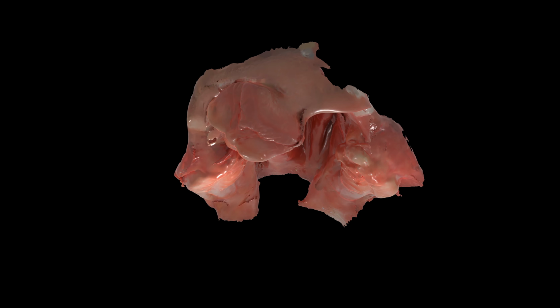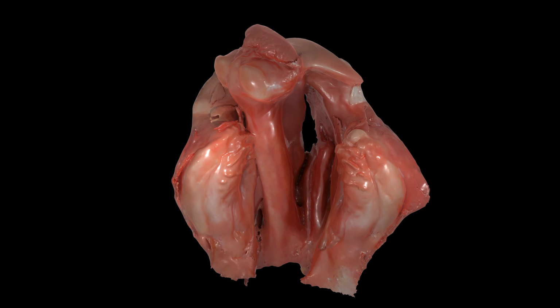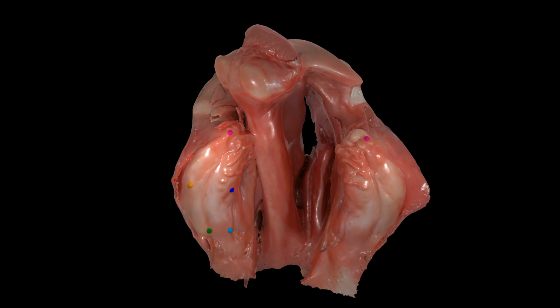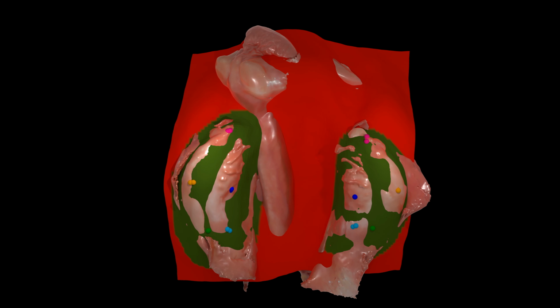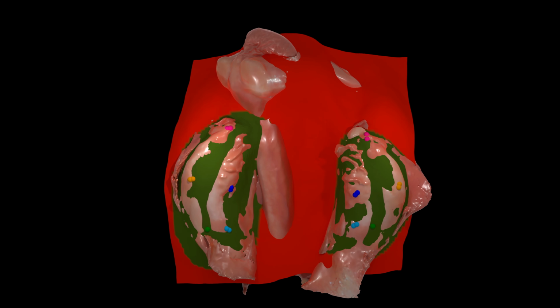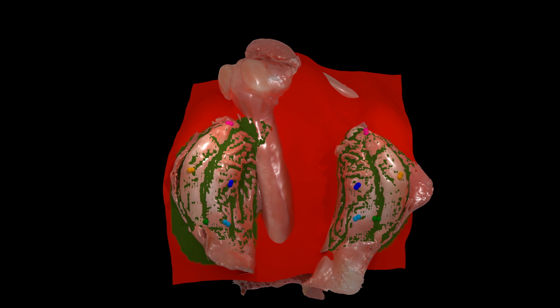Cases with bilateral cleft lip and palate are handled almost identically. Another 2-stage DiffusionNet model, trained specifically on the bilateral cleft types, also predicts 10 landmarks using a similar scheme. We designed a separate template for bilateral cleft lip and palate scans. Since our passive plates do not cover the premaxilla, only the alveolar ridges are registered.